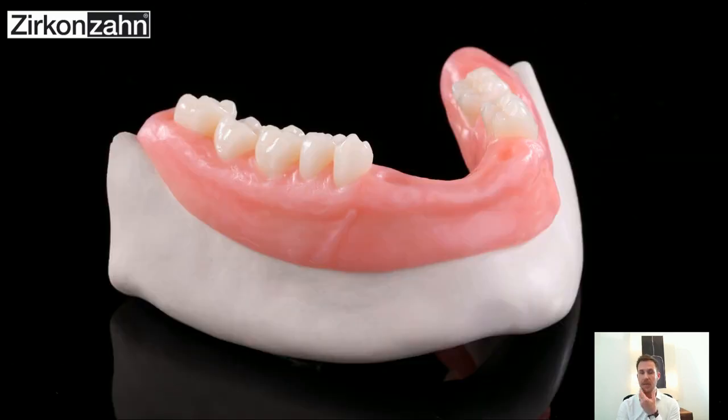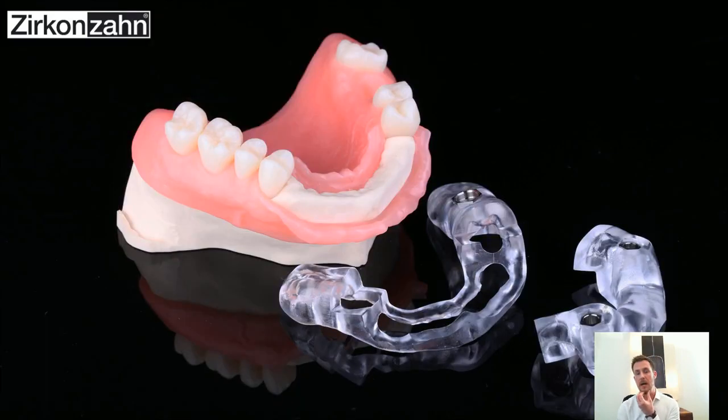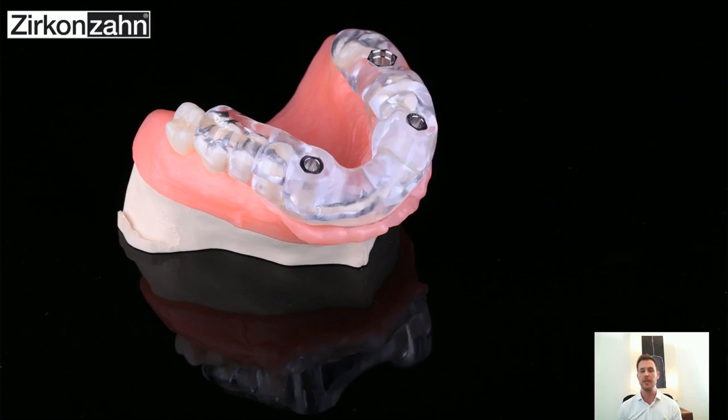In the future, we will have a stackable guide as well. That means a split guide, not anymore this kind of simple guide. If somebody uses the flapping method and also wants to reduce bone and needs a guide to reduce the bone, then we will provide this kind of instrument in the future. So we have a split guide, one guide as a bone reduction guide, and then when you're done with that, you just put the other guide onto it to make the drilling happen.